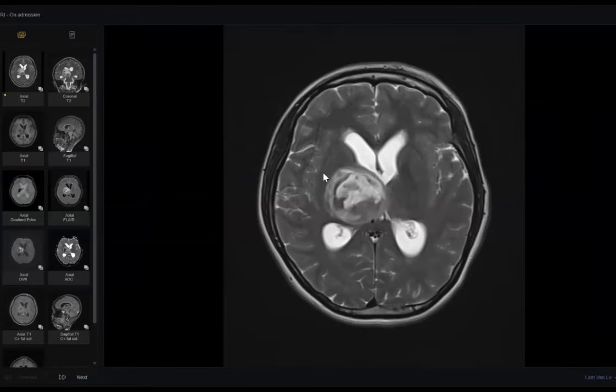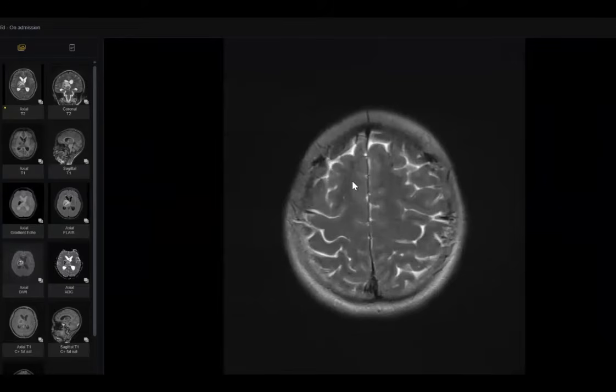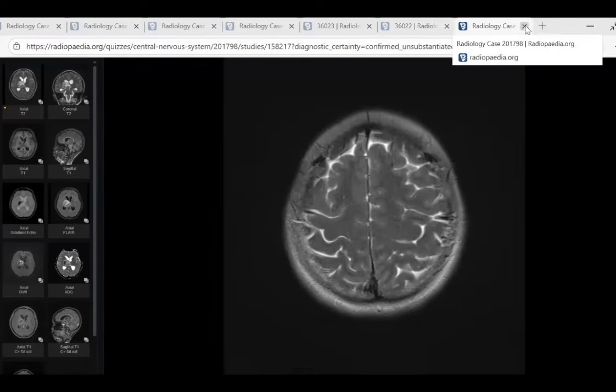You must try to pick up any clue, any cause, any pathology. This is our main task as radiologists. Thank you so much. This case shows us many of the basics of MRI. Next candidate.